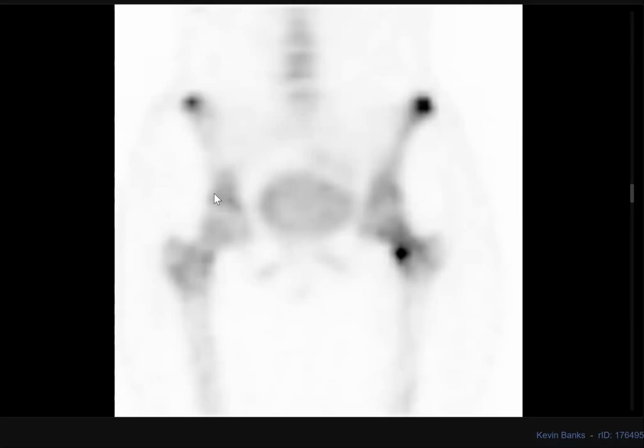On the left side, I would like to know about the patient's history as well as the age of the patient. If it is an old age patient, it could be something metastatic, like a pathological fracture. If it is a young patient, then it could be due to some tendon injury leading to fracture of the lesser trochanter, or just a stress fracture. Lesser trochanter fracture in an adult is pathological.